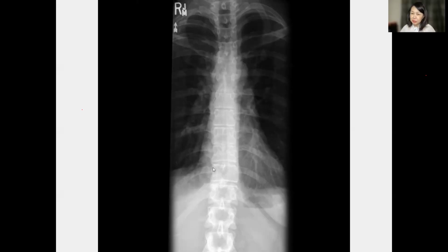Oh, on Facebook also, Nithya got it. Kiat Jing also got it. Okay, well done. Nithya did very well. Nithya got teratoma also. Okay, what else? Okay, so always remember to review the spine. Good.